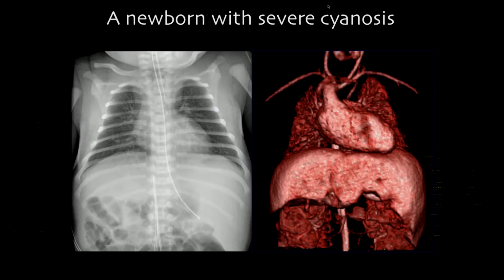The right side and left side have a bat wing coming down, which means that you have right-side duplication on the left side too. It is highly suggestive of right isomerism. In polysplenia, usually the liver is very squared, not like a bat wing like that.